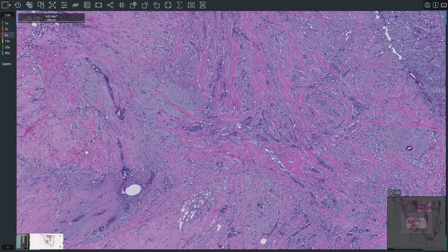The element in the bottom left corner of the navigation panel is optional and displays the macros of the glass slide and its label. To zoom in the macros by a configurable amount, hover the mouse over the element. To configure its visibility, click the Show Hide Layout Configuration window button on the toolbar.